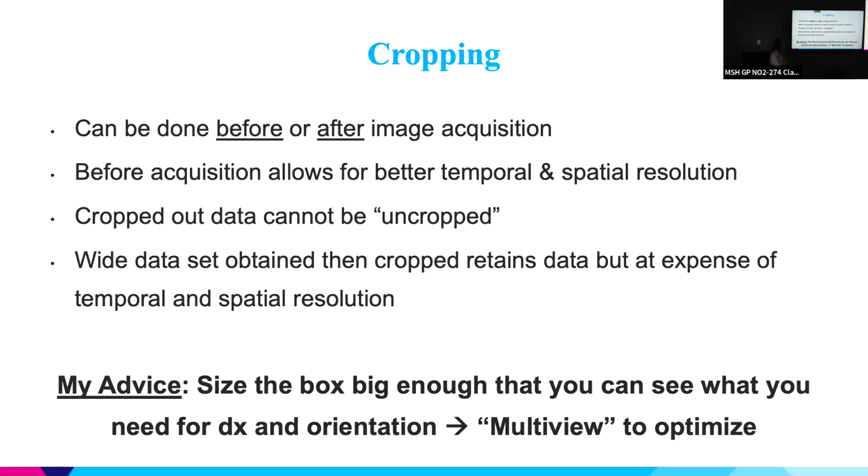So how do you get the best picture? Well, cropping, and especially if you have a full volume, you're going to need to learn how to crop. For a majority of the talk now, we're going to be talking about cropping. Cropping can be done either before or after. Every time you 3D zoom, you're cropping because you already cut out what you need, right? But let's take it a step past just 3D zoom. Remember, only make the box as big as you need it. The bigger it is, the more you're unnecessarily decreasing your resolution and frame rates.